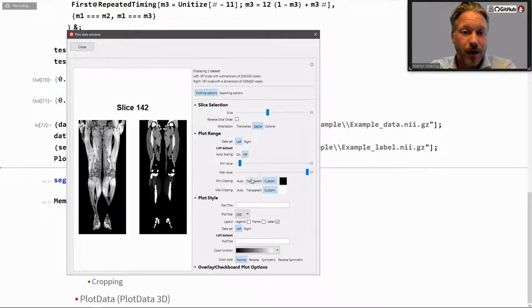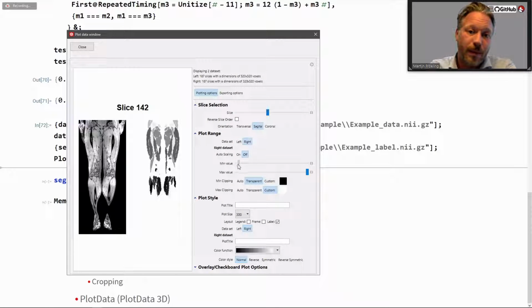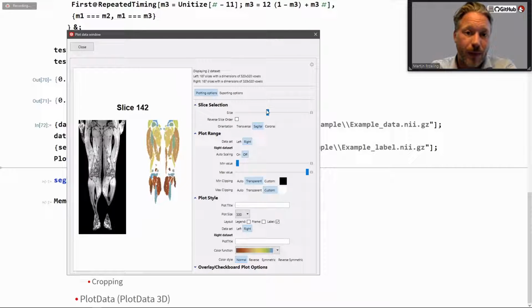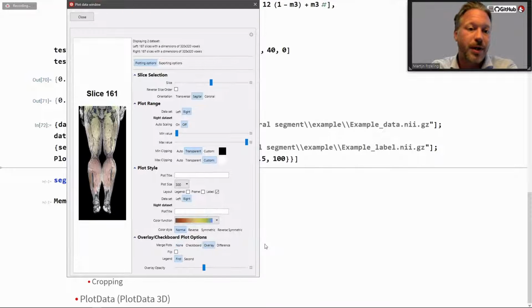So let's overlay those on the, oh, that's the wrong one. Transparent. Overlay this on the data. So the right one is actually integers, where we want to show which muscle is which. So we have integer labels that we can use to identify which muscle is which.